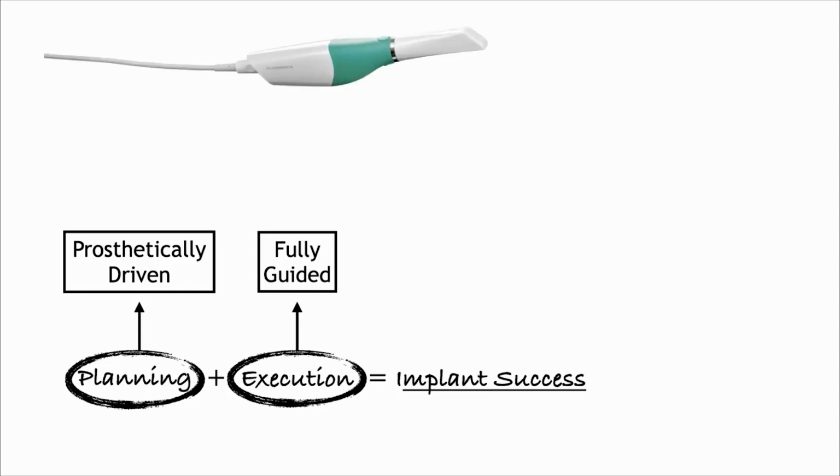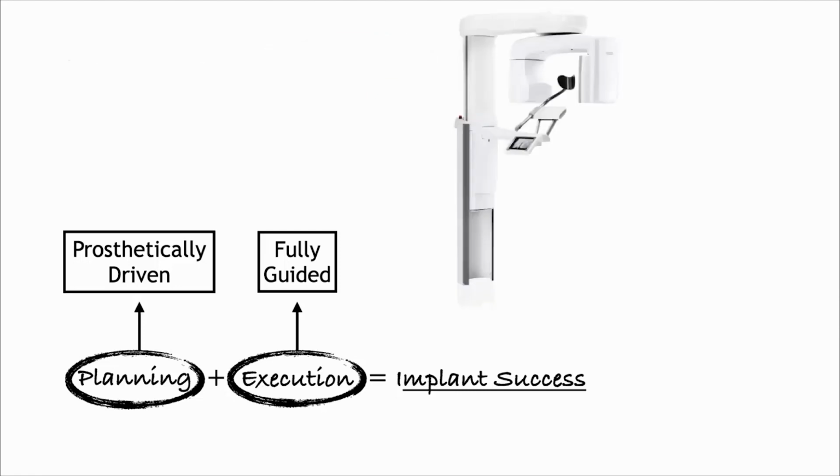We need an intraoral scan or a digital model inside the mouth of the hard tissues and the ridge, right? So when we're planning implants, for sure, most critically, we need a 3-dimensional CBCT of the patient. And those are the essential components for the planning process.